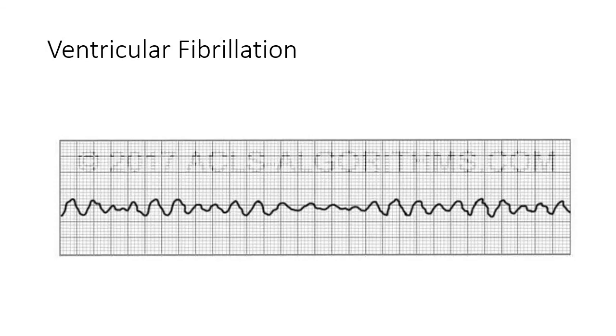All right. It is very chaotic looking. There is no organization. You see no QRS complexes. You see no P waves. You just see a squiggly line moving across through there. Okay. Now, if we had regular QRS complexes embedded in this, then you can make an argument that that was atrial flutter. All right. But with this one, remember, the heart is just kind of sitting there quivering. Nothing is happening. All right. Everybody see why this is VFib? Okay. Electricity is the treatment for this.